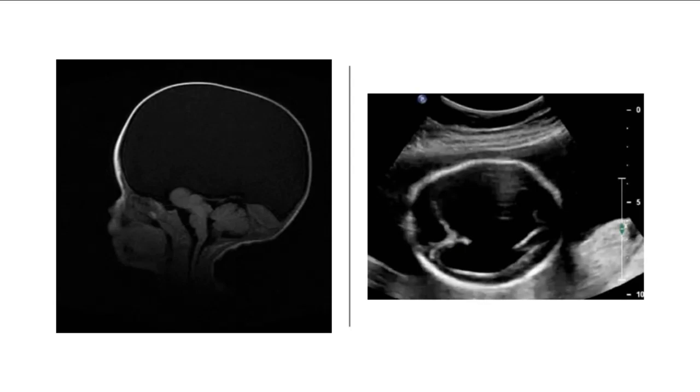Fluid-filled cranial vault. Really no, if you look on that MRI picture on the left-hand side, we have the brainstem, we have the cerebellum, posterior head, we don't have any cerebral tissue because it just was not getting any blood supply from those ICAs. So all of this is where the baby's cerebral tissue would be. If you look at this baby's head, it looks massively enlarged, right? So the baby's skull had to enlarge to accommodate all of that fluid.